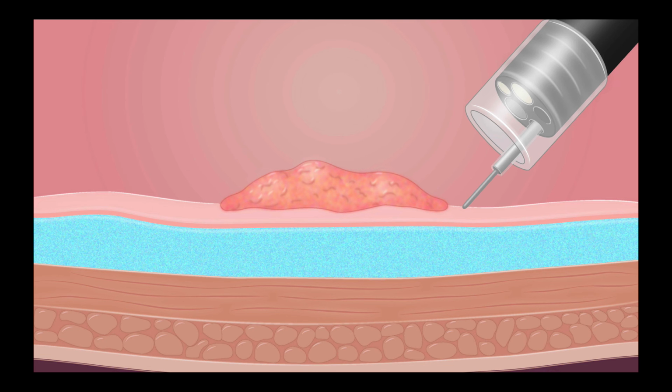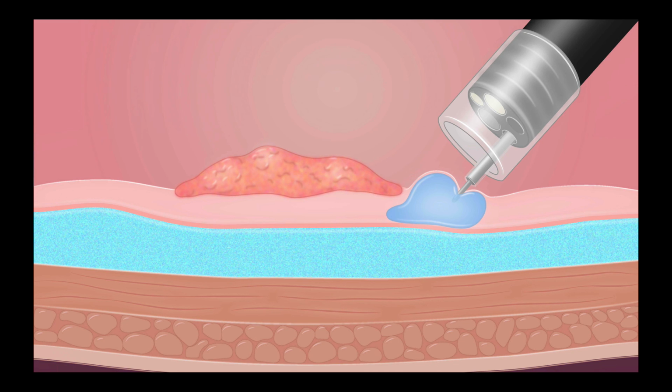On the other hand, if you create a mucosal injection like this with a mucosal bleb, don't pull the needle out. Instead, push the needle further in to find the submucosal space. And once you find the submucosal space, inject more fluid to create a nice submucosal bulge.